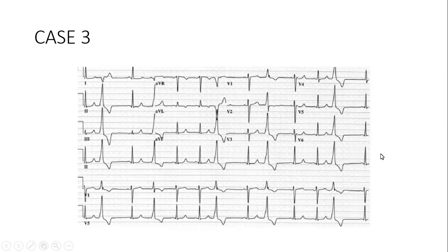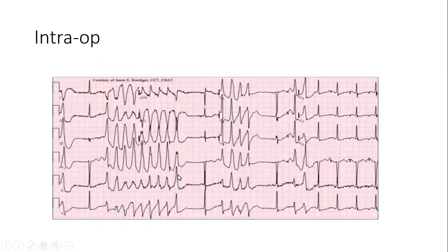Let's say the same patient, you take to theater. You saw the patient like this in the ward, patient hemodynamically stable, no issues. These premature ventricular contractions were not so regular. In about 10 minutes, you take the patient in, and then the patient intra-op changes into this. So what is this? What's your spot on diagnosis? And how would you manage it?